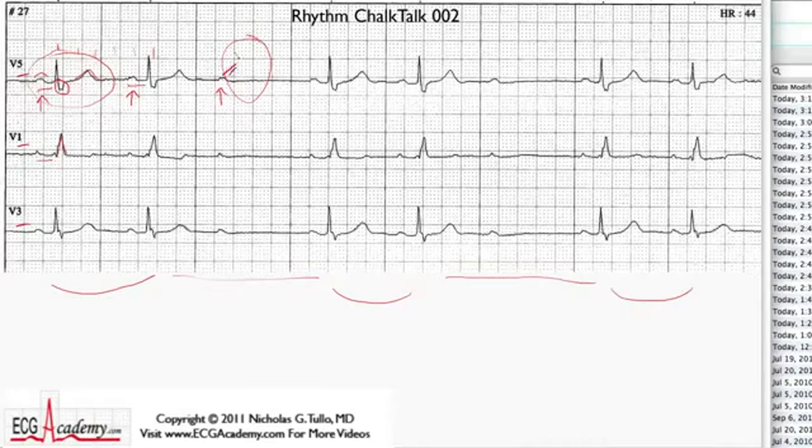So it appears that AV block has occurred, because this P wave never got down to the ventricles, and somewhere in the AV conduction system the signal never got through. Well, let's keep on going. Following this pause, there is another PR interval that's 0.2 or so, another one that's fairly constant, and then this P wave blocks. And so you have AV block with a fixed PR interval.